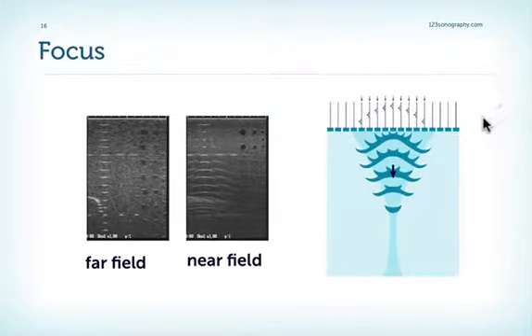So in reality, an ultrasound beam looks something like this, where we have an area where the width of the beam is very narrow, and this is also the focus point. What is the result? Well, take a look at these two images here. Here on the left, we have a region where the focus is fairly far down in the far field. You can see that we have a very good delineation of the points down here, while here in this example, we have the focus point in the near field, and thereby the best resolution is right here.